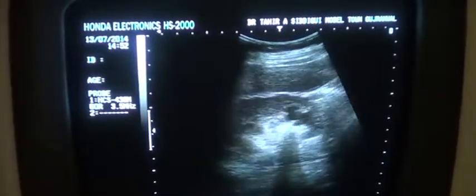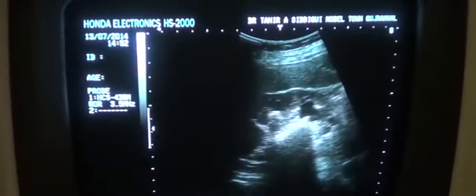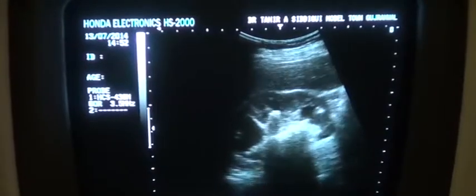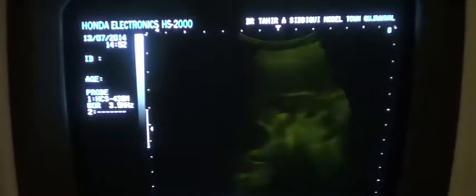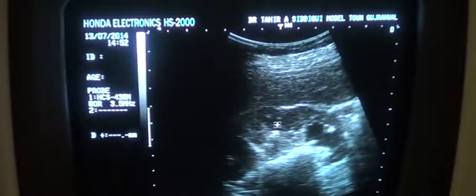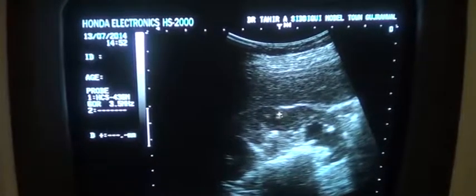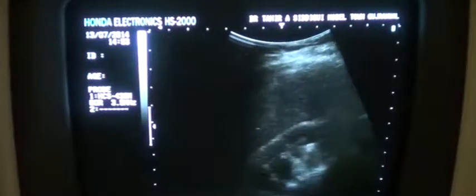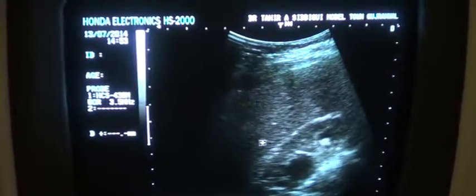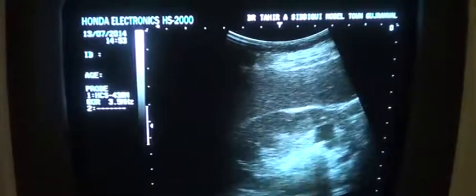Now this picture is very commonly seen in cases with Staghorn calculus, as Staghorn calculus also gives the same appearance on sonography, on ultrasound, as you are seeing here. And you can see that the pyramids are intact. This is, for example, one pyramid with an arcuate vessel, this small tiny structure anterior to it. This is the parenchyma. Parenchymal echogenicity is normal compared to the liver, because normally the echogenicity of the parenchyma should be equal to the liver or less than the liver. Now this echogenicity is equal to that of the liver, so the parenchymal echogenicity is normal.